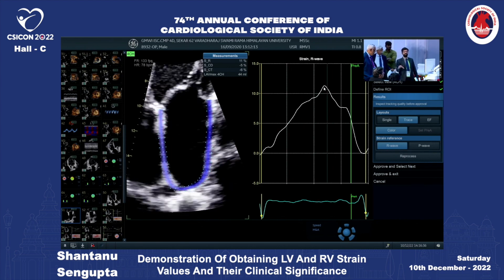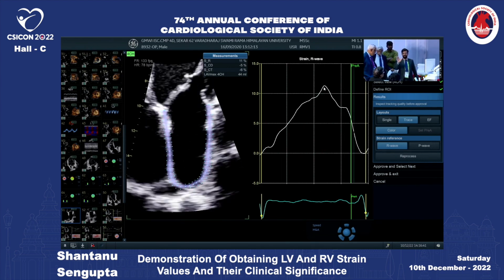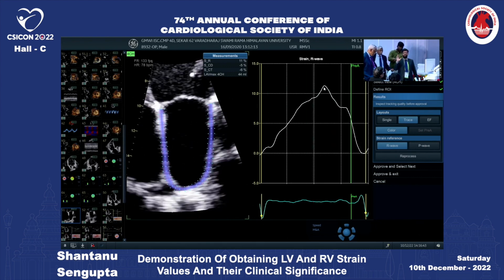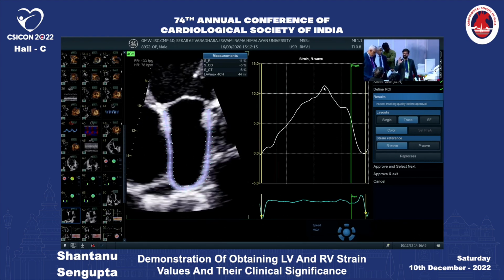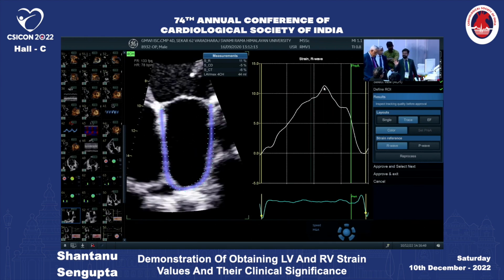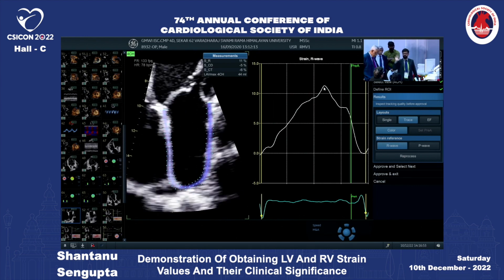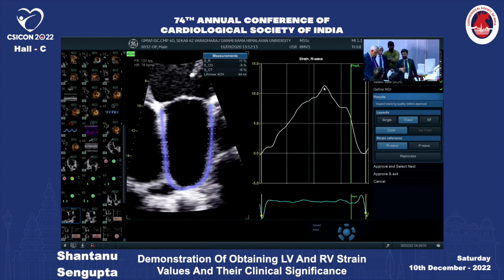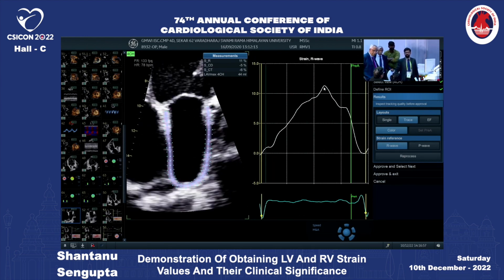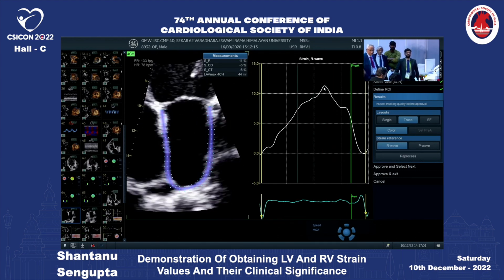So in our situation, sir, to your question, my report will be hypertensive heart disease, LVEF of 60%, concentric LVH, GLS of -12.1, PALS or LA strain of 11%. He is in stage B, 100%. So this is HFpEF for sure, and he needs treatment. Any questions?